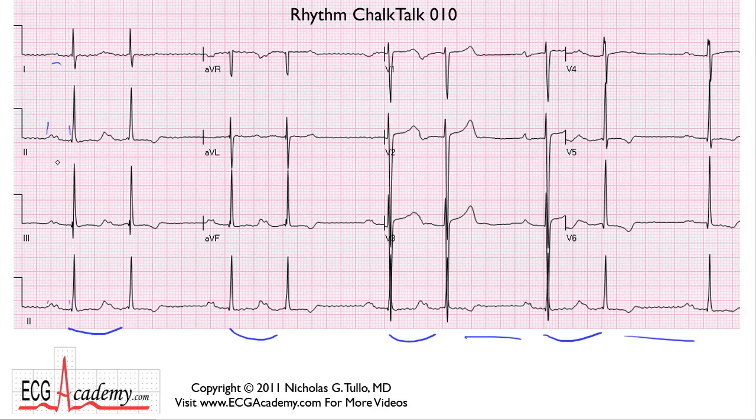And when you're looking at the 12 lead on the whole, you can see the voltage is extremely generous. You clearly have criteria for LVH with a very deep S wave in V2 and a tall R wave in V6. Plus, you've got this characteristic strain pattern in the ST segments and the T waves. So you can call it LVH with strain. And I think you could probably look at this P wave in V1 and decide there's possible left atrial enlargement because you've got a fairly hefty negative deflection at the end that's one box wide and one box deep.